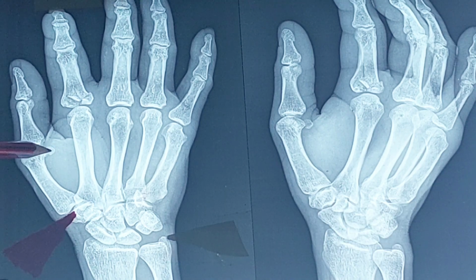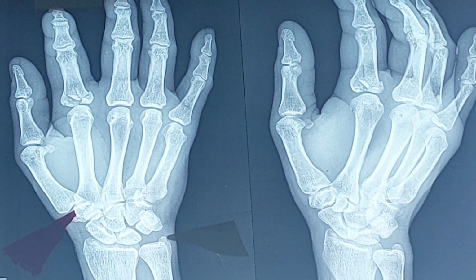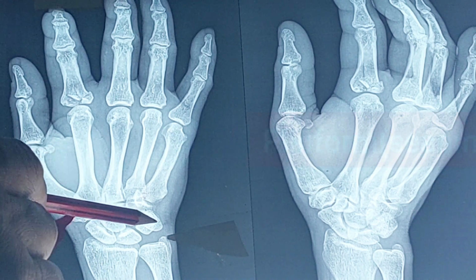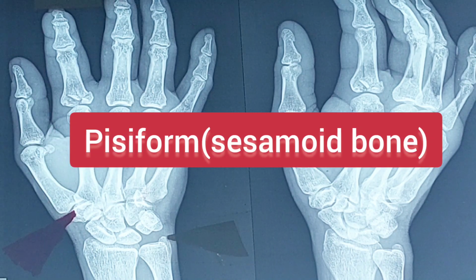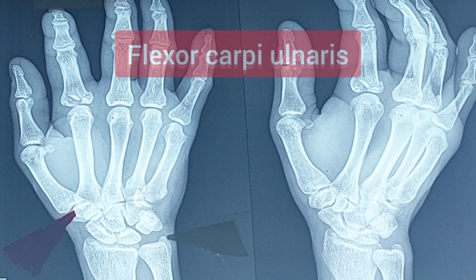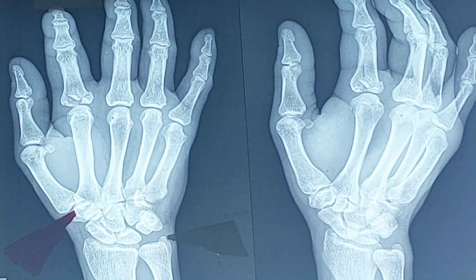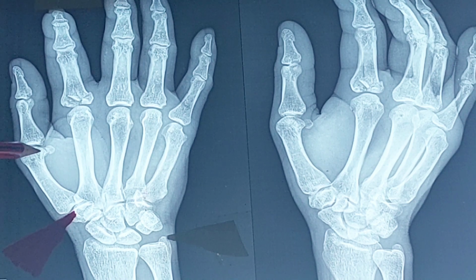Can you see this small bony projection? This one. That is one sesamoid bone. If you are asked, show any sesamoid bone in this film in the hand, the first example will be this pisiform bone. Pisiform bone is an example of sesamoid bone, and this bone is developing under the tendon of flexor carpi ulnaris. And if you are asked to show any other sesamoid bone, can you see? Yes, this is one sesamoid bone under the head of the first metacarpal.